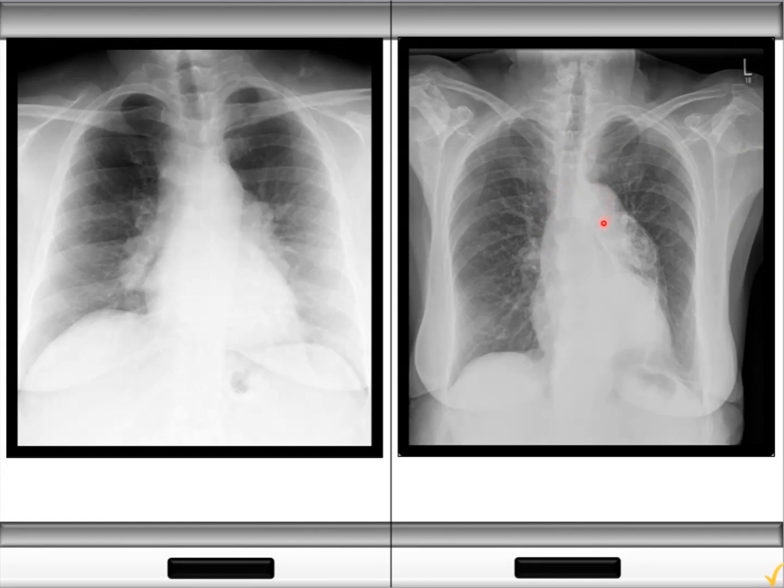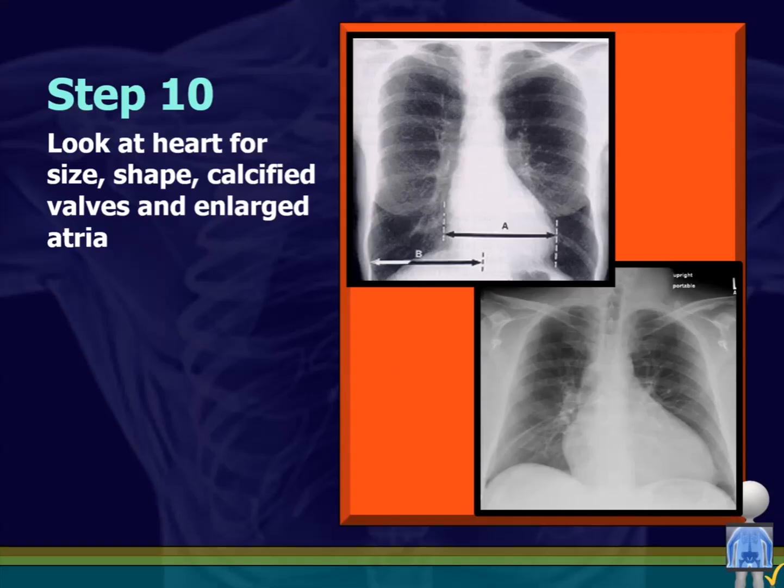Not everyone has a knob that you can see, and it should come down like this. But instead, it's all over here because this is an aortic aneurysm. This is a thoracic aortic aneurysm, and we can see the widened mediastinum that can occur in a thoracic aortic aneurysm. Okay. We can also see mediastinal changes in pericardial tamponade and gross effusion, things like that, where we'll see the mediastinum widen as well.